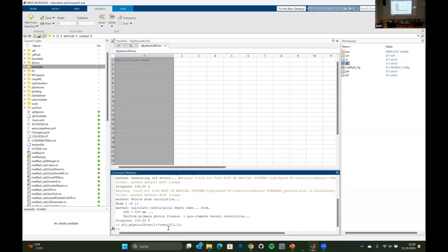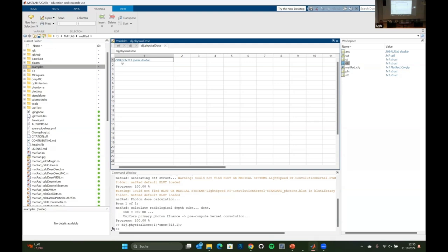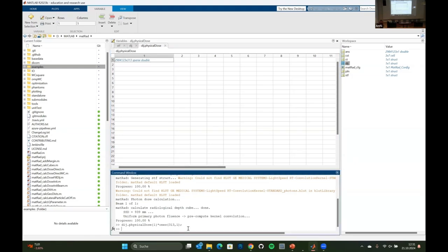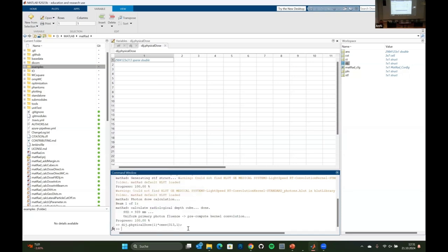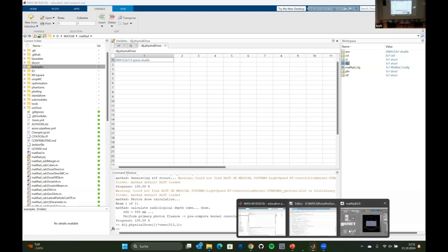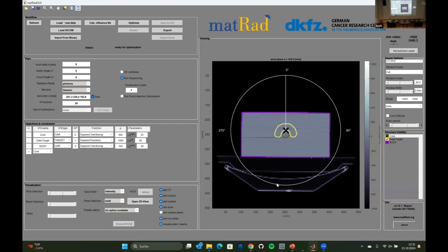And I can guarantee you that every treatment planning system has this object, maybe not exactly like we store it. It might be separated by beams or by organ, but they use this object because you can calculate the dose for an arbitrary modulated beam just by multiplying with a vector. Okay, so this object now lives in our background.